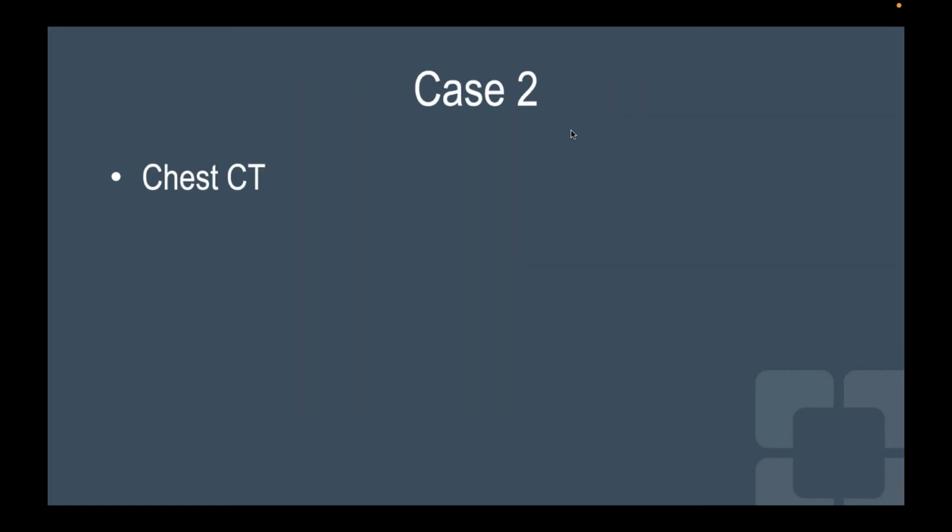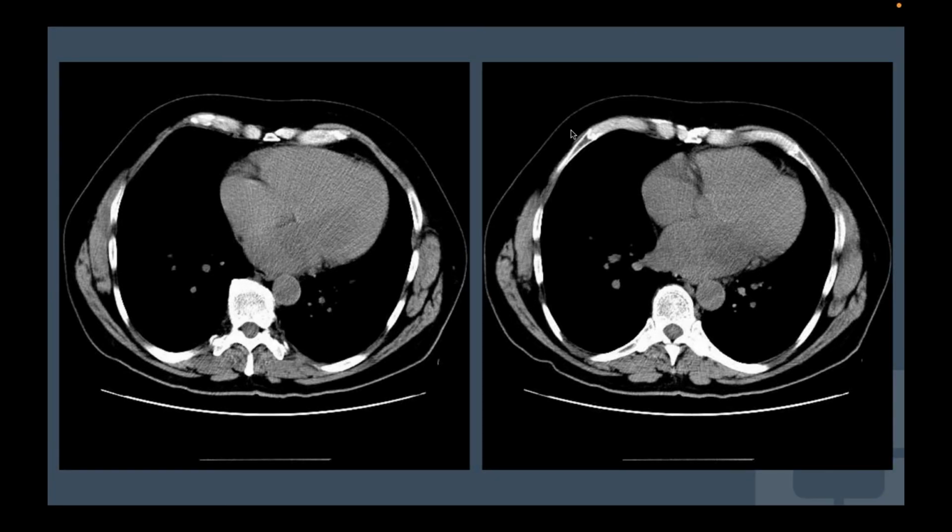All right. Here I have a chest CT, and I don't remember what it was done for. It's also an older case, but I thought it was a great case to show. So I have 2 slices through the middle of the chest. Any comments? Any observations? I see a low density in the left atrium. Maybe I'm overcalling it, but it doesn't seem to be the kind of low density you usually see from streak from the spine. Is that the finding?